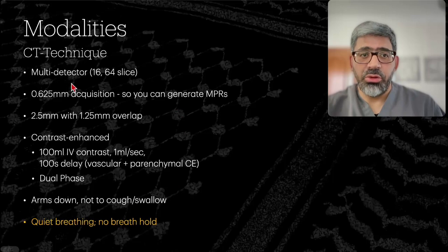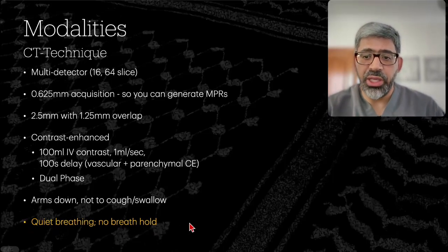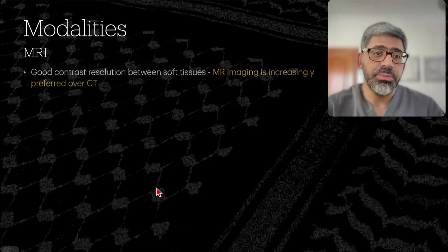This is an example of a CT protocol. We want to emphasize the importance of doing quiet breathing rather than breath hold to keep the vocal cords away from each other and easier to assess.